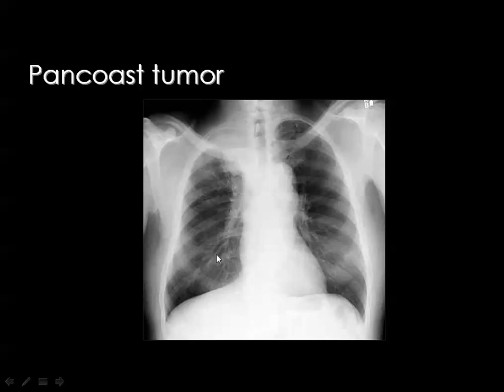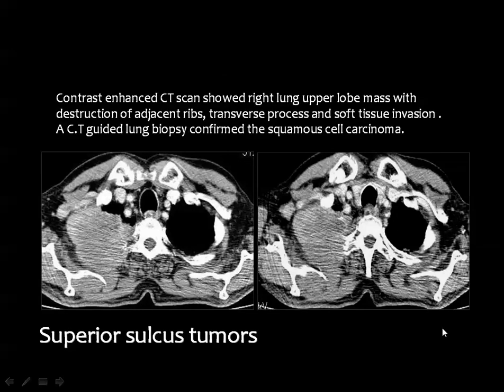This does not contraindicate the diagnosis of Pancoast tumor, and you should have a CT scan, because CT is more sensitive for detection of bone erosion, and also more sensitive for detection of chest wall invasion and extrathoracic extensions. And here's an example.